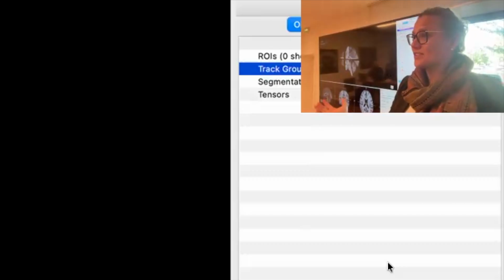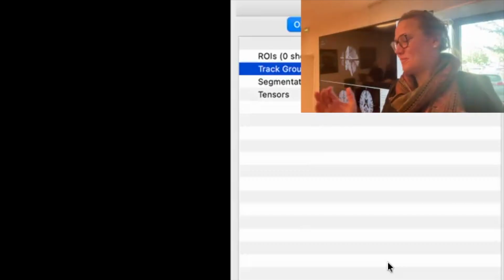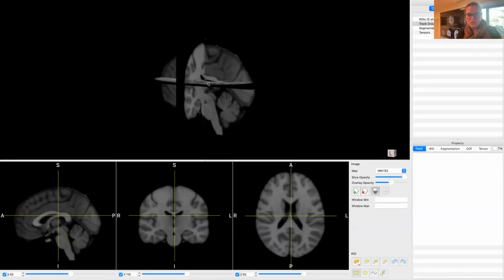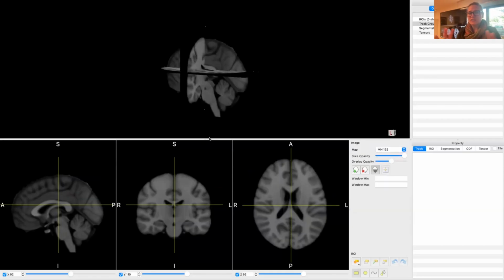So now the white box is gone, but so are our connections, sadly. Okay, but don't worry, we're going to bring them back. So what you can do is you can drag those boxes back and forth to maximize the view, because we're now starting to draw at the bottom panel.